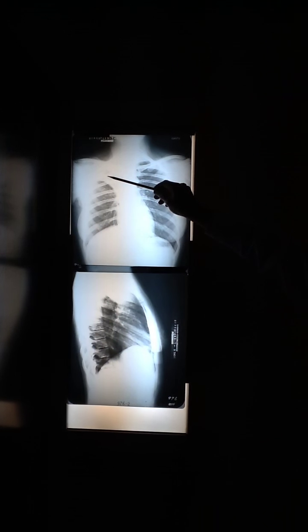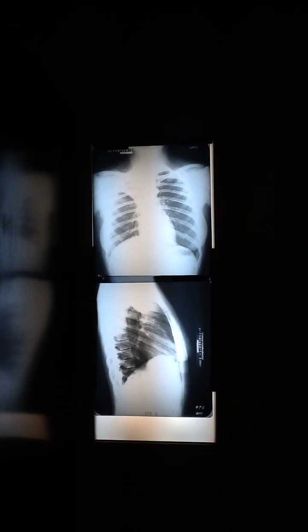minor fissure. Okay, you can have that kind of density from atelectasis, you can have that kind of density from consolidation, but only one of them moves the fissure, right? So we know the fissure should be down here, now it's up here. So it has to be a volume loss, doesn't it? Yep. Because the fissure's moving toward the increase in density, and that's the number one direct sign, isn't it?